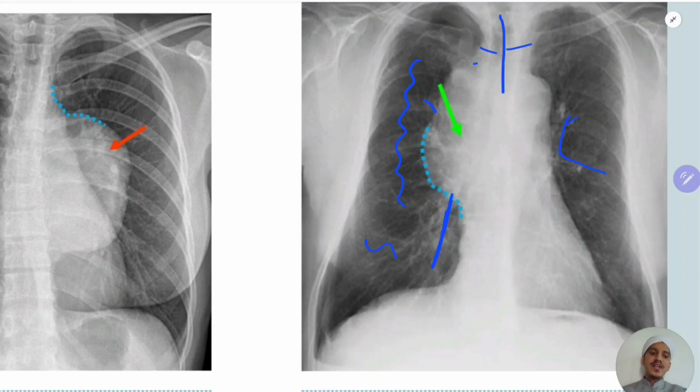In pneumothorax, the mediastinum will be shifted, you will see a visceral pleural line, and you will see increased lucency between the pleural line and the rib cage border. If you combine the history with the X-ray, it will be very easy to say whether it is a mass, pneumothorax or collapse. But if you don't have the history and are interpreting based only on the chest X-ray, then these are the things which will help in differentiating collapse, mass or pneumothorax.